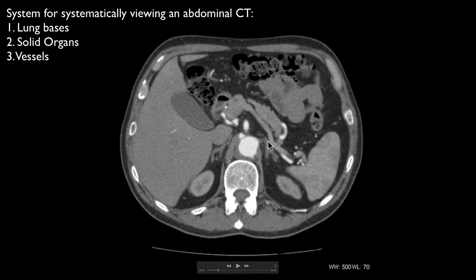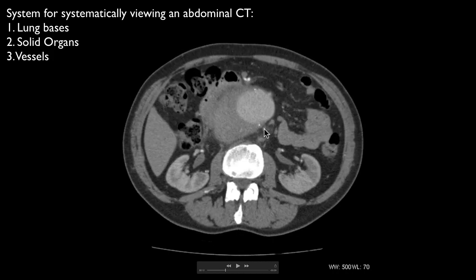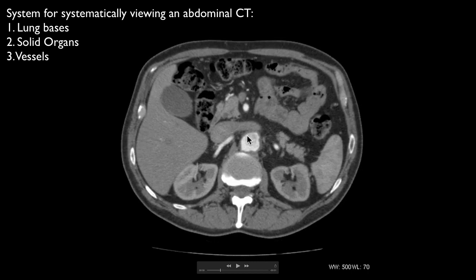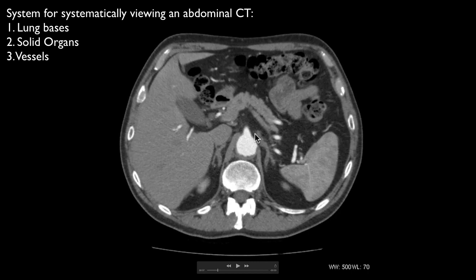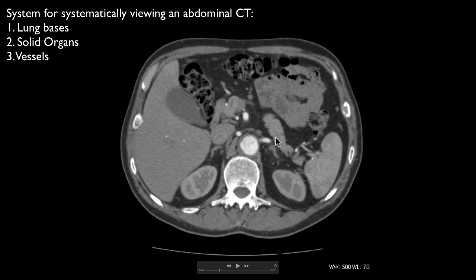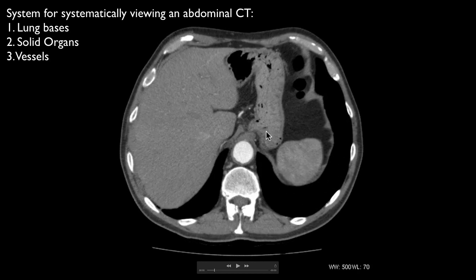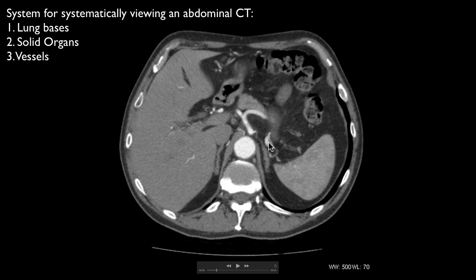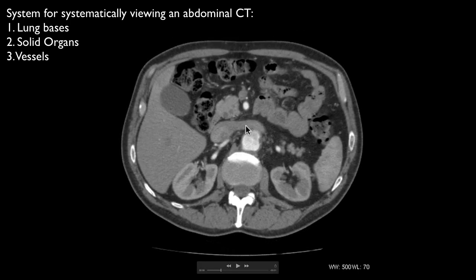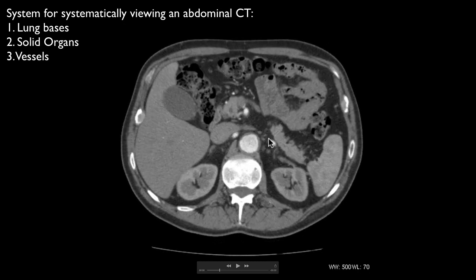They don't always come off at right angles at the side there. You can often see accessory renal arteries. I don't think there is an accessory in this case, but they're always worth looking for, and also important if you're planning some sort of intervention for this kind of thing. Yeah. So lots of these get stented now, and you want to know where the renals are, because if you put the stent across the renals, that's bad news. And you can put stents down the renals, or have little slits for the renals, but you need to know beforehand.